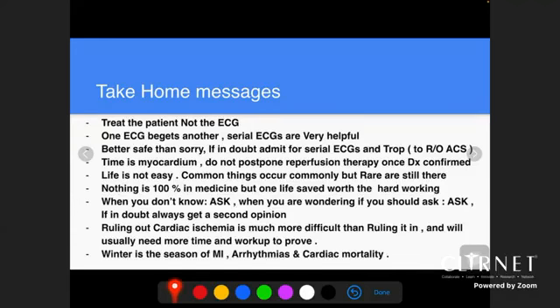Also, you can have some ST elevation in the ECG, but the patient is young and he doesn't have any cardiac history and he's asymptomatic, and it will turn out that the ECG changes here are due to early repolarization or some arrhythmic syndrome like Brugada syndrome, sometimes electrolyte abnormalities. So ST elevation can be with a normal patient and the reverse: ECG can be normal in a patient presenting with an early STEMI.